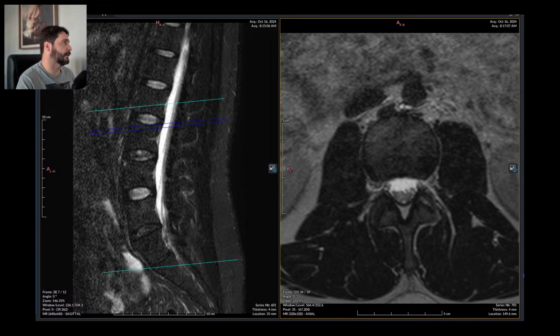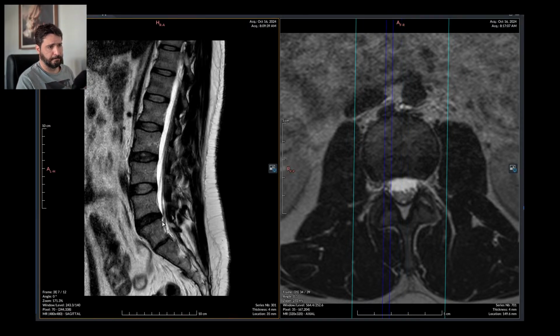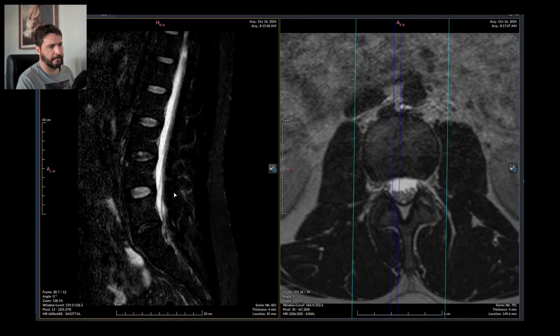We have our entire report right here. I'm just going to grab a template because I have a template for mostly anything. I'm just going to say tiny osteophytes. Excuse me. Where is that? Yeah, right there. Right there. This is L4, L5. So tiny edema spot right there.